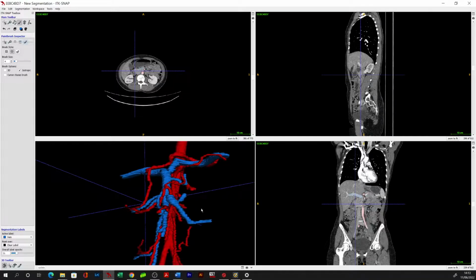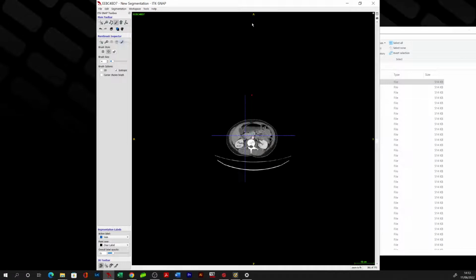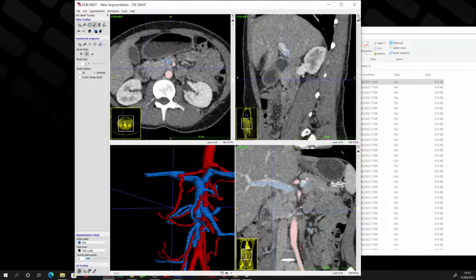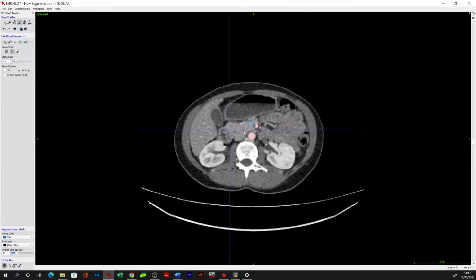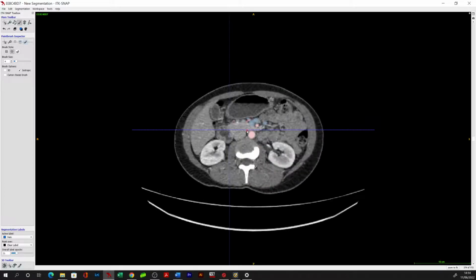And if you can follow these out, these eventually will join up to be all one continuous circuit. But it's not going to be that clinically relevant, and it's certainly not, if you've got a CME surgeon, necessarily going to be anything they're that interested in. So it's just more of a point of anatomical interest, as opposed to something which is going to be detrimental to the case.